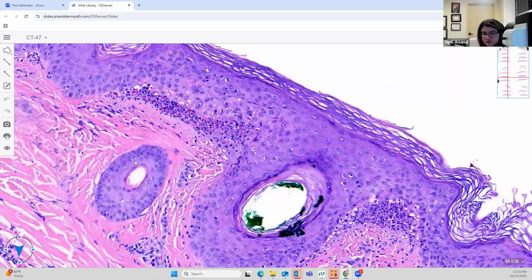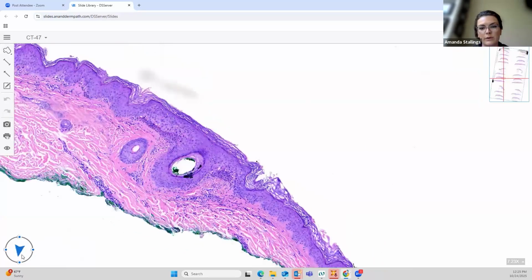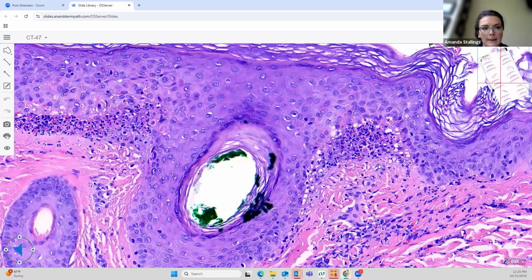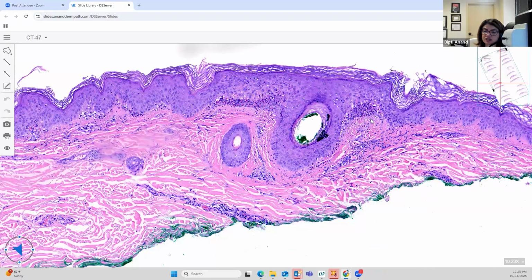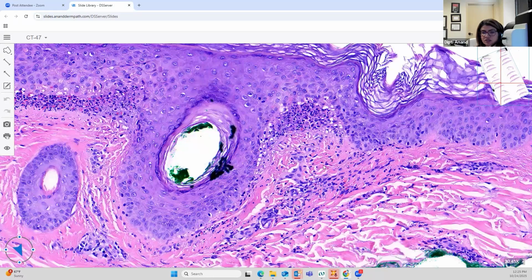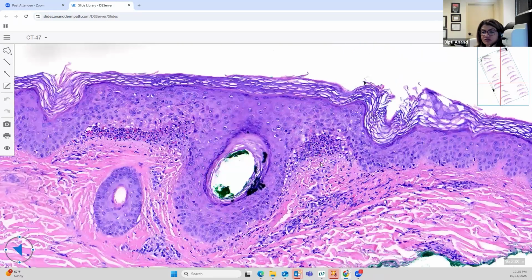So what's happening in here? So it looks like there's a little bit of a subepidermal blister with neutrophils on epidermal papillae. Yep. So dermatitis herpetiformis. Yes. So the answer here is DH, and you can see the nice subepidermal vesicle with the neutrophils at the tips of the dermal papillae. Okay. You have the neutrophils at the tips of the dermal papillae, which you can see over here.